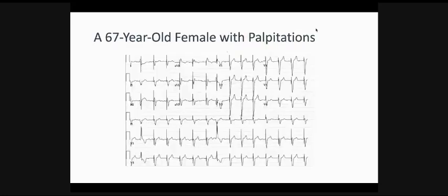A 67-year-old lady with palpitations, and we'll go through this. So this is like a professional level, and you expect to find similar ECGs in your board exam like this. Just be careful coding this and don't overcode things.